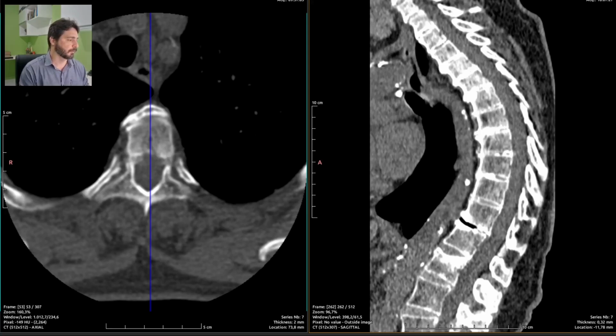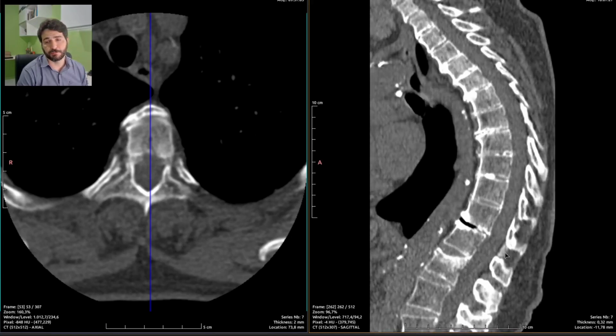Yep. Oh, just mistyped something. Hypertrophy. Yep. So this is an insufficiency fracture on a spine of an elderly woman related to osteoporosis. This is really common. It's quite painful. So lesson learned.